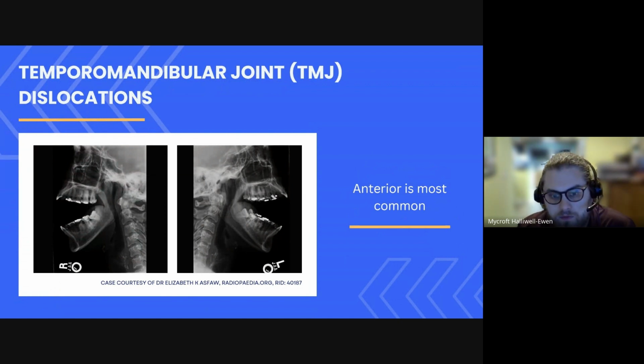Yeah. So that's where it should be. That's the joint. That's where it should be. It is locked open. Yeah. This is really, really painful. Really hard to reduce, because remember, it's the same with any dislocation. You need to make it worse, i.e. try and get this head just beyond this little prominence before it gets better. And it's enormously painful. All the muscles seize up.